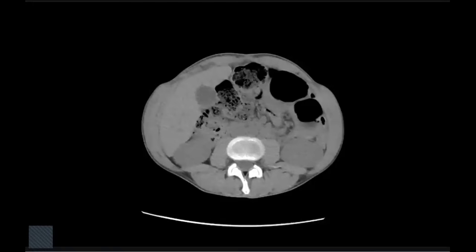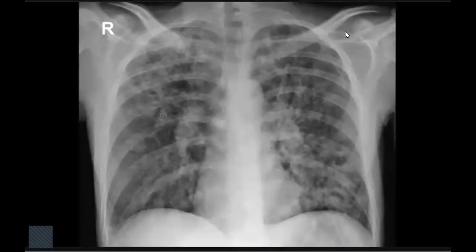Okay, your second case, you did it very well. Yes, ring-like cystic changes in both lungs, predominantly in the upper lung zones. Here it is very important to mention the pneumothorax, likely to be chronic, because there are some situations like this, but it is very, very important to mention it.